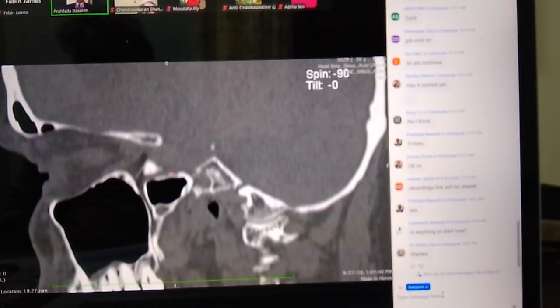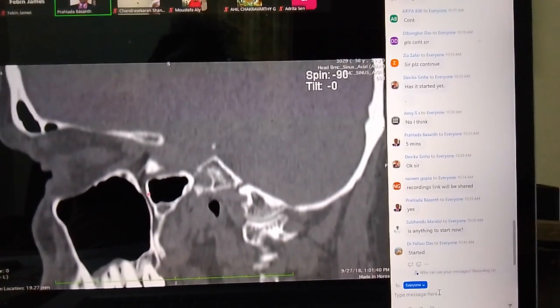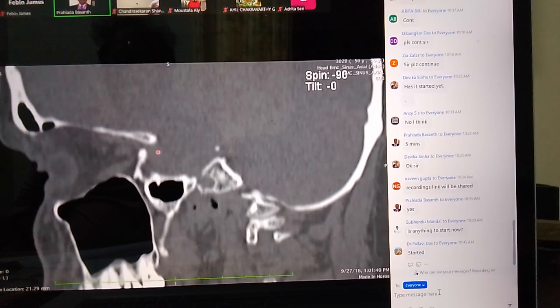So we didn't appreciate the foramen rotundum well there. We'll try to go back and see the palatine canal and pterygomaxillary, the pterygopalatine fossa. Okay, and the pterygoid process with pneumatization. Okay, and this is the orbit and orbital apex.